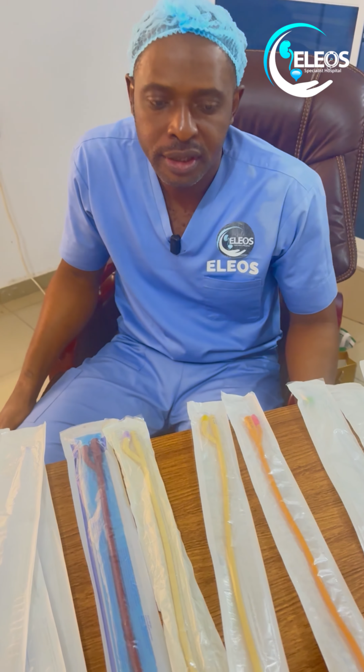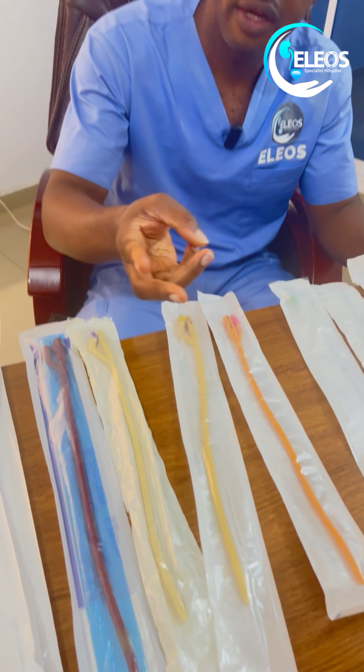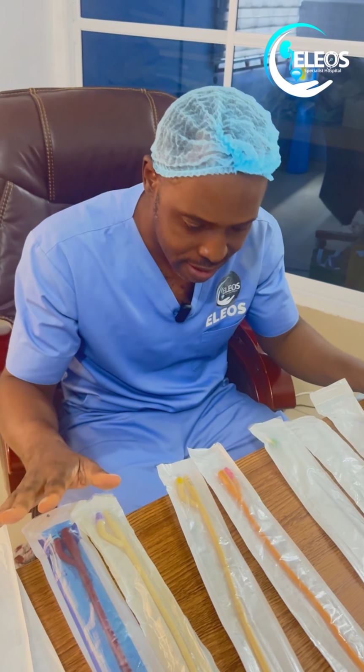Okay, good. So today I want us to look at catheters. This is very, very interesting for medical students, for people in residency training, whether you are a junior resident or a senior resident. It's very good you know about catheters.